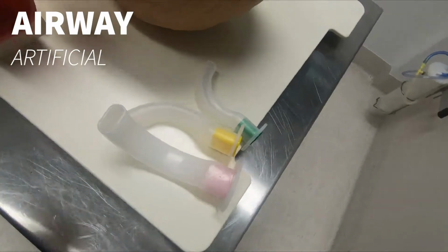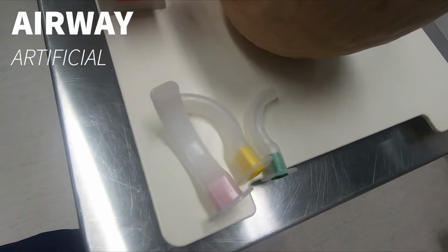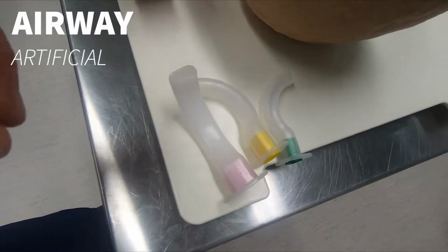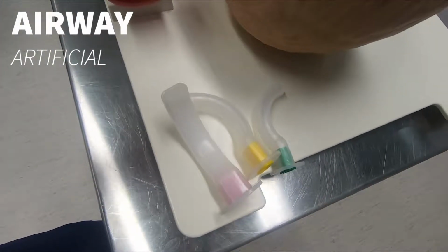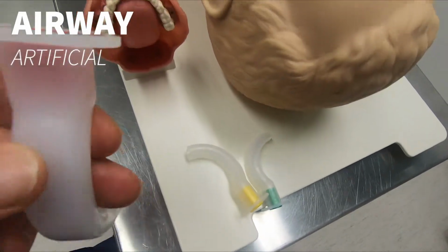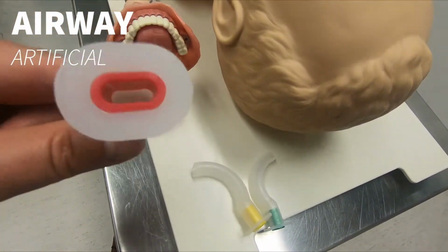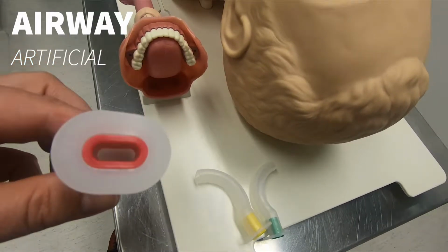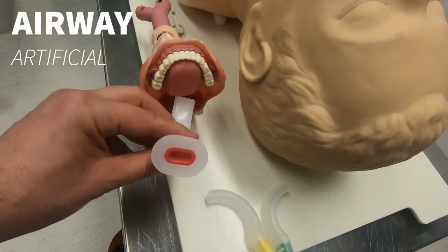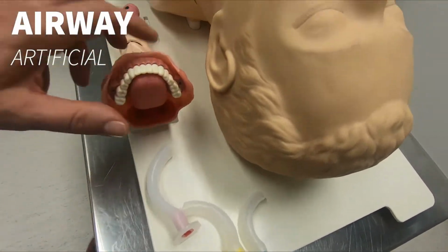So here is the first adjunct, which is not the nasopharyngeal, it's the oropharyngeal or the Guedel. Apparently, allegedly, it saved more lives than anything else. In the First World War, these little units were placed in people's airways and kept them breathing and alive. Otherwise, often the tongue may have occluded the airway and we have a problem.